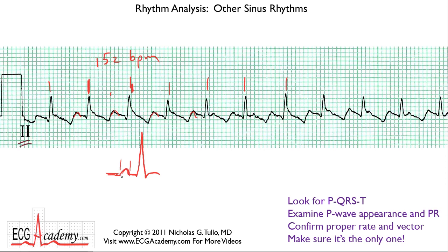Now, not always. You should be looking for a fairly discrete signal followed by sort of a flat segment before the QRS complex. And I would say that the flat part that follows this deflection kind of slopes down a little bit. And that has me bothered. It doesn't look flat to me. And the P wave really doesn't look like a P wave. It's very narrow. It's a very short upward deflection followed by sort of a slopey signal. And don't get fooled into thinking that this is sinus tachycardia, as I'll show you why.